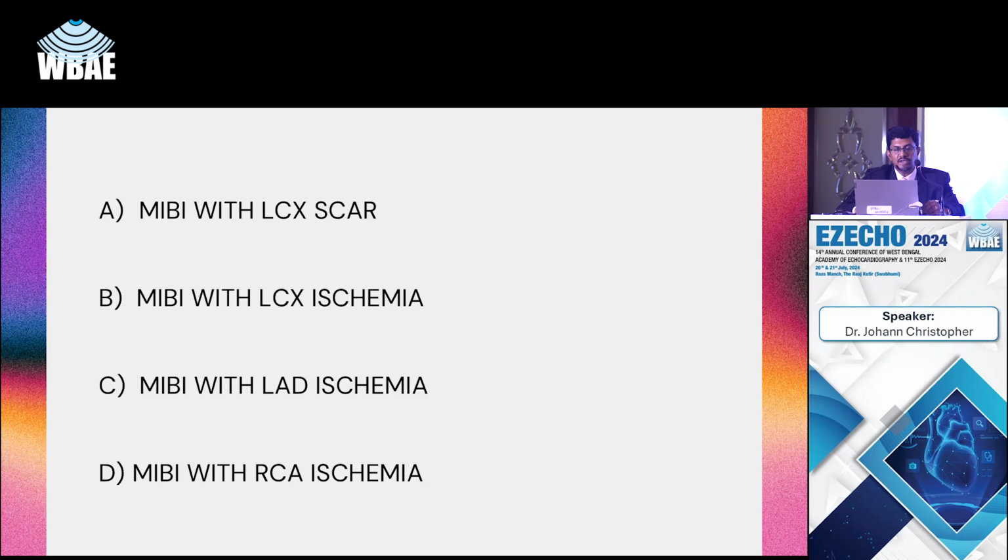A post-stent patient came with recent onset breathlessness. You want to rule out anything happening to the stent. Focus on the red arrows. The above image is stress and the lower image is rest.